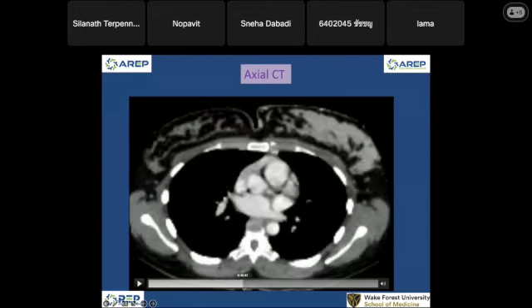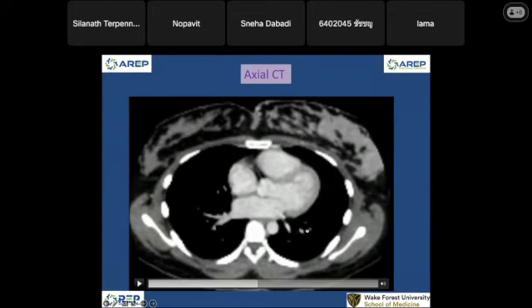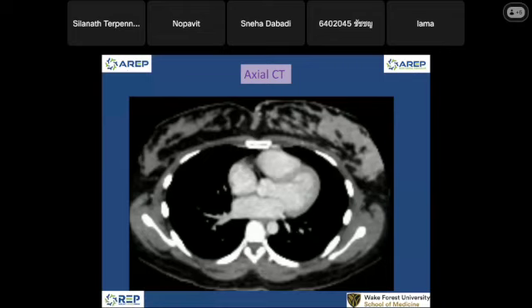And then you saw we also look for something else. So this person is a young person. The bone doesn't look so bad, and she has a very dense breast soft tissue. The left breast looks a bit denser. I'm not sure why. If it is a young patient, we probably leave it alone, because we don't normally do mammogram when we start screening for breast cancer. We start at 40 years old. She's for sure younger than 40 years old.